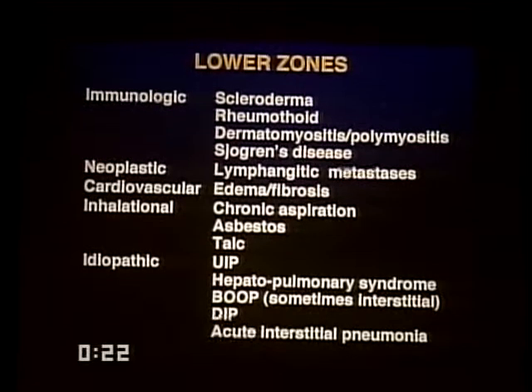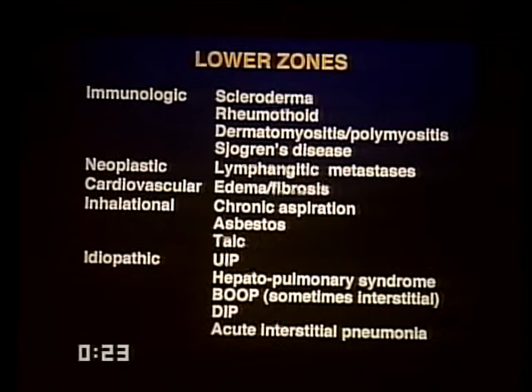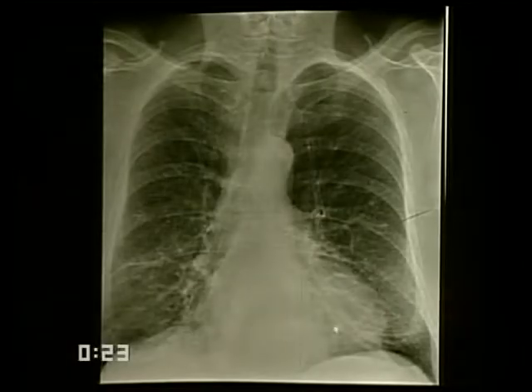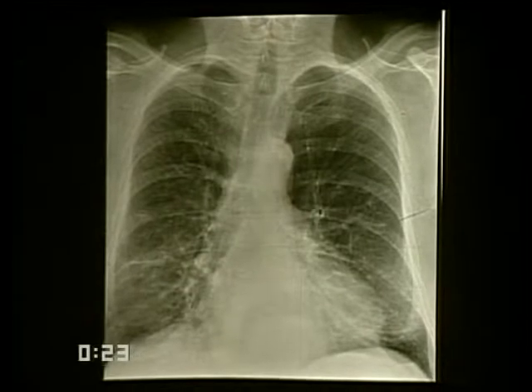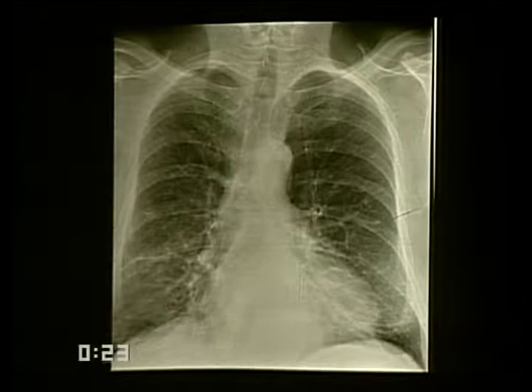Lower zone diseases: think of common things first. Common things commonly occur. This patient, unlike most of the others, the lungs look relatively large. While I have said that interstitial disease is characteristically a restrictive abnormality, many individuals who are exposed to disorders that will give them restrictive diseases also smoke. This particular patient, if you look behind the heart, you will identify a hiatus hernia.